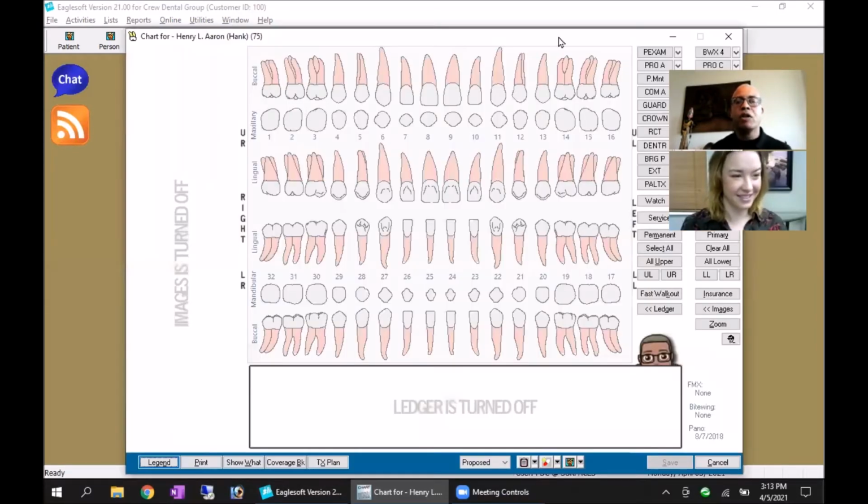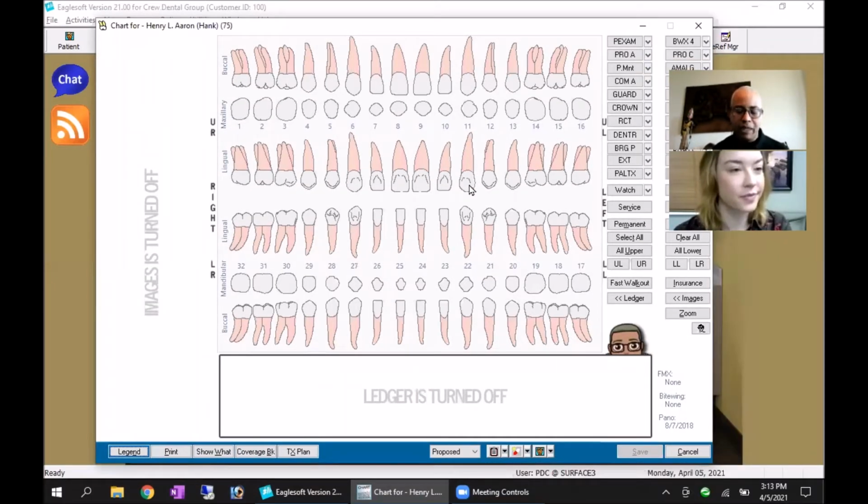Okay. So first things first, whenever you're talking about implants, you're talking about even dentures, the best thing that you can do is get your code set up properly ahead of time so that they're doing the things you need to do. Because one thing with dentures, I see a lot of offices where they don't even put tooth numbers on dentures, which even sounds a little weird.